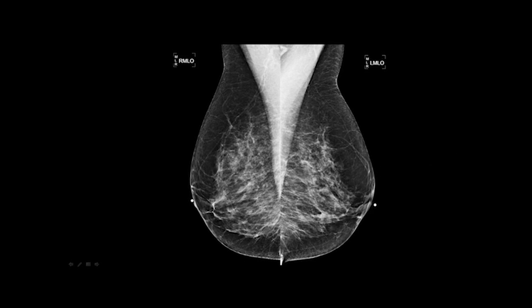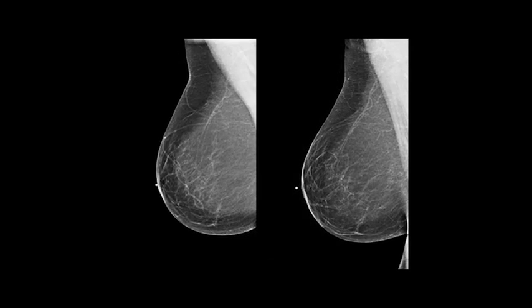So this is beautiful, but it's missing the IMF, and they will mark you off for that on the report. Otherwise, it's beautiful. So that one major part of the anatomy is gone, and they don't like that. They do not like that.